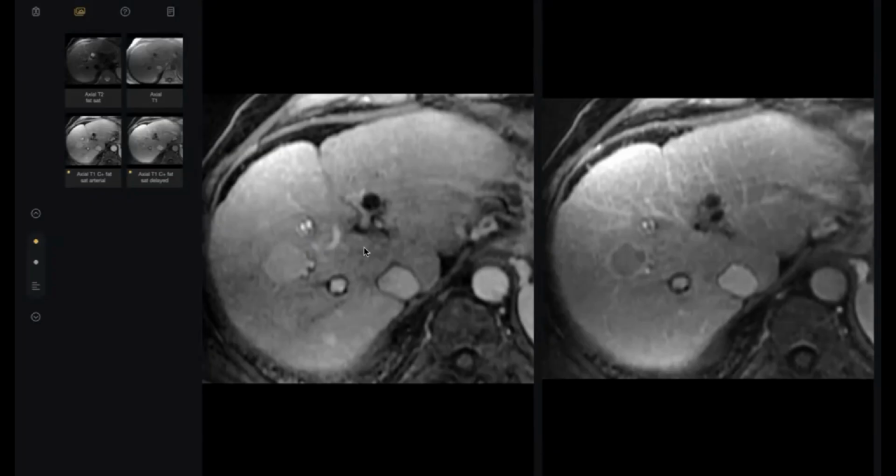By the way, anyone who wants to do the LI-RADS, we will measure the maximum size. To diagnose HCC with LI-RADS, you need the three criteria plus more than 1 centimeter. More than 1 centimeter will put you in the LI-RADS table. But if you are above 2 centimeters, it is highly suggestive of HCC. There are two different pathways: 1 cm, from 1 to 2, or above 2 cm. I think this lesion will take at least LI-RADS 5. It is sure or highly suggestive of HCC, and I will give it LI-RADS 5.